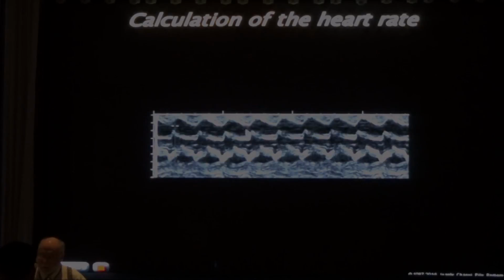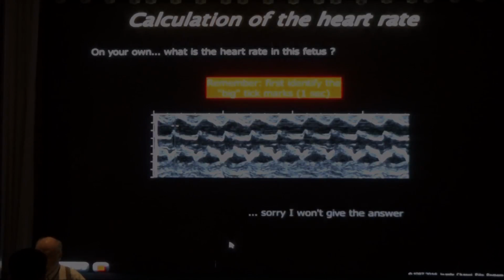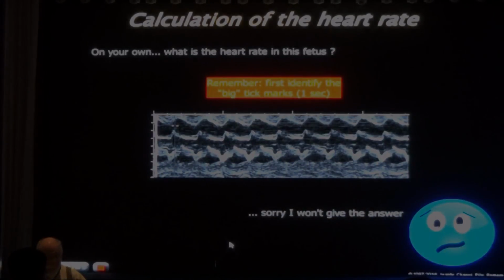Now, what is the heart rate in this baby? You look at the big tick marks, the small tick marks, and I will not give you the answer. You have to download the lecture and you have to make the exercise on your own. Very simple answer.